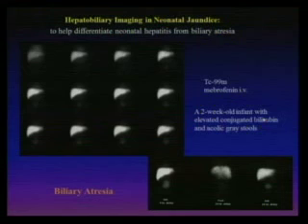Okay. So I see uptake in the liver, but I don't see the ducts. Oh, I already gave you an answer. It is biliary atresia. Yeah, so I just want to show you this is exactly the same as the CBD obstruction. So the history, age, everything, but just no excretion in the biliary tract.